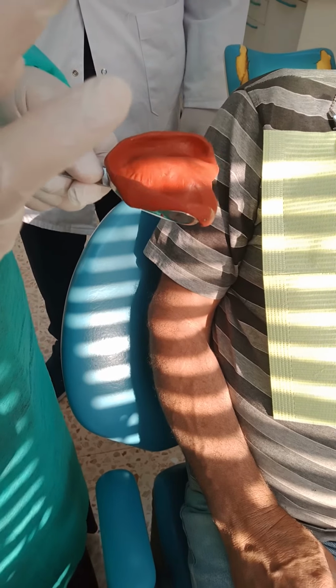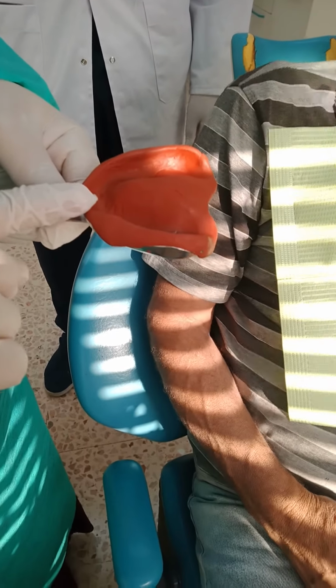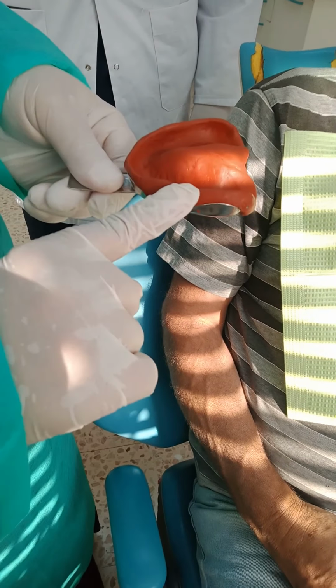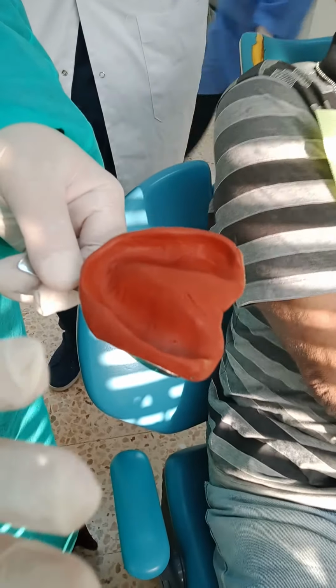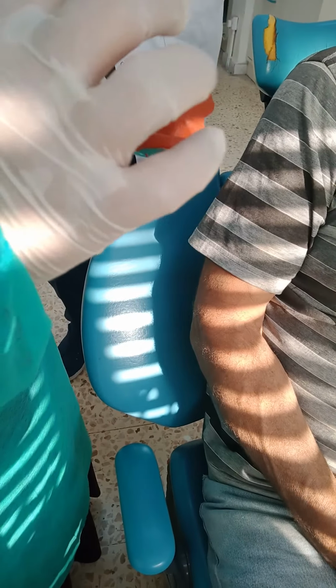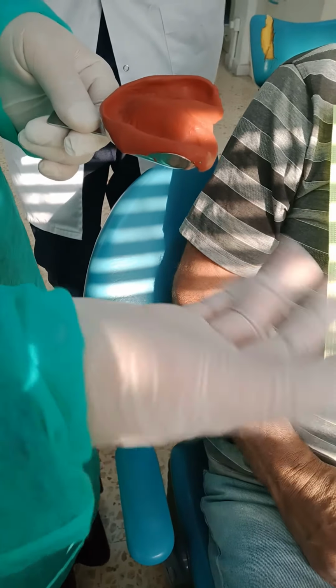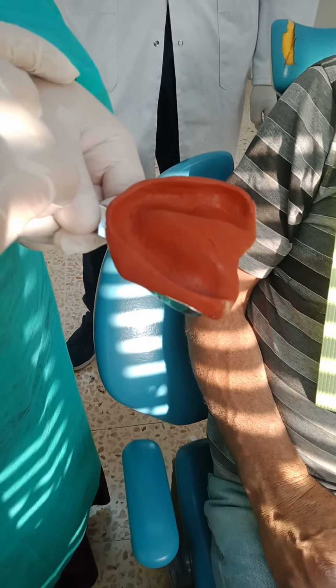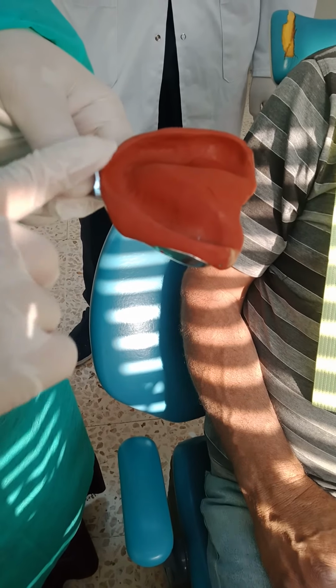The anatomy is telling me that you have not taken the anterior area correctly, where I see that the labial sulcus is very shallow. In the upper, the labial sulcus is deeper than the premolar area. This is how it should be, unless we have combination syndrome, which is a specific syndrome with specific features. This patient doesn't have combination syndrome from intraoral examination. So the anatomy is telling me your impression is incorrect. Why? The labial sulcus should be deeper than the premolar area, but it is very shallow here.